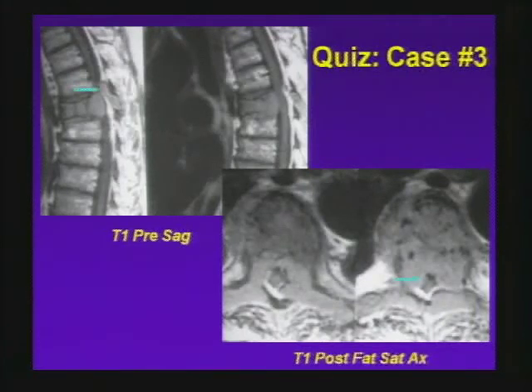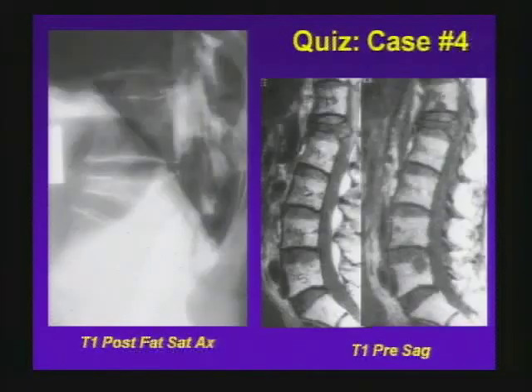But it's certainly neoplastic, and it was a plasmacytoma. Here's number 4. And again, same history.